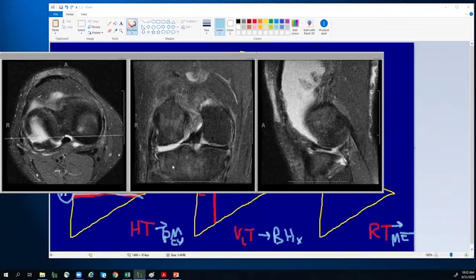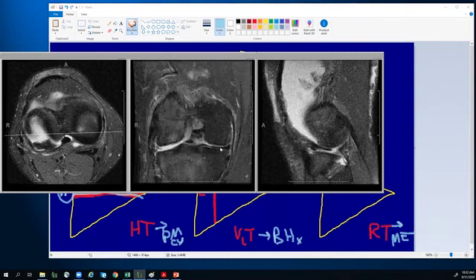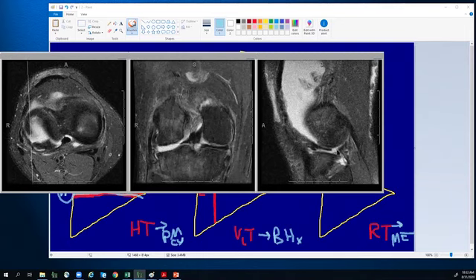Sorry about that. But great, in the chat, people are describing the ghost meniscus referring to that eye of the hurricane, meaning that you could see where my cross-sectional slice is on this axial image. As I migrate into the tear, it basically disappears. That's the ghost meniscus. And anytime you see truncation along the inner margin of the meniscus, you should be thinking that you're dealing with a radial tear. So this nicely demonstrates on the axial that radial tear with the large gap that has been created by a displaced radial tear.